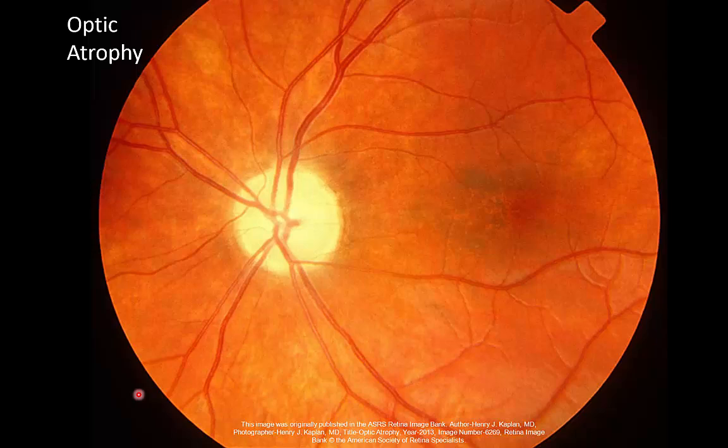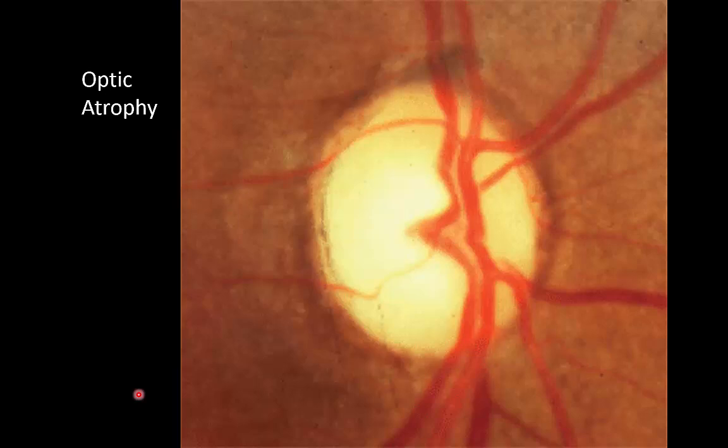Say you had optic neuritis and it was very bad and you made a poor recovery, you could have a disc that looks like this in the end. Here's another case of optic atrophy. Again, the optic nerve just looks like a pale moon. We really cannot make out the nerve fiber layer very well at all.